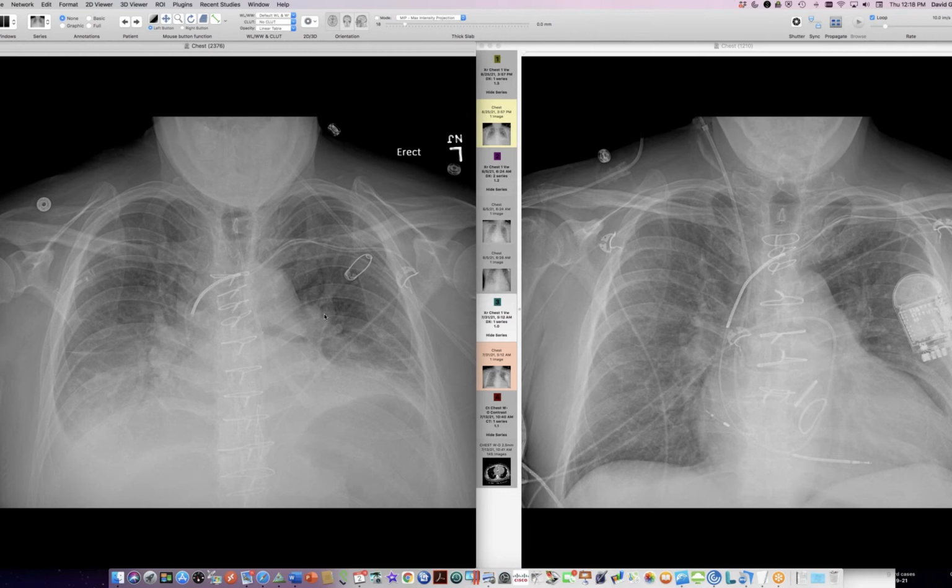So this person is short of breath now. This is a recent radiograph, short of breath after this heart transplant, unable to lie flat, which is very provocative. Low lung volume on both sides. So the question was, could this be bilateral hemidiaphragm paralysis following heart transplant? Person had a CT scan at the time, or around the time of the previous surgery, but before the transplant, it showed normal thickness on both sides. I don't think I need to show that. So everything looked good. We don't have a subsequent CT.